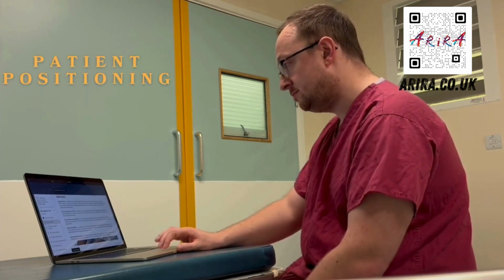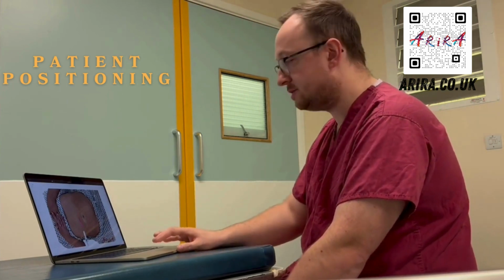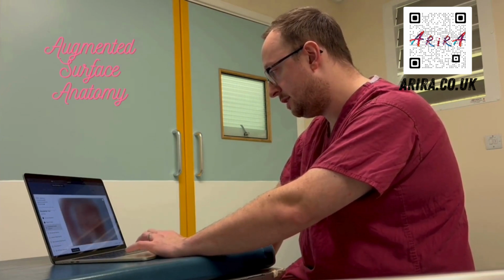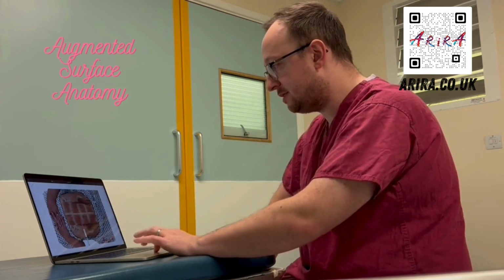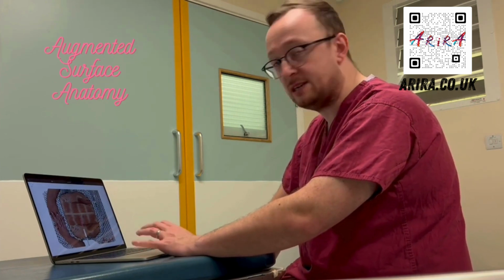So I'm just moving on to patient positioning now. You can bring up a nice diagram of how to position your probe as well. Let's talk about the relevant surface anatomy. Again, we've got a nice diagram similar to the one before, but overlaid with the relevant surface anatomy now, where you put in your probe, what structures can help to identify the correct placement.